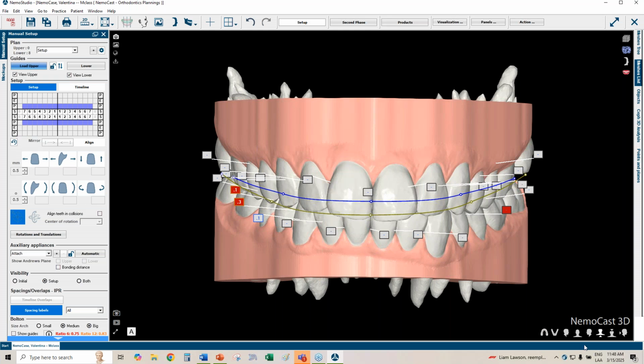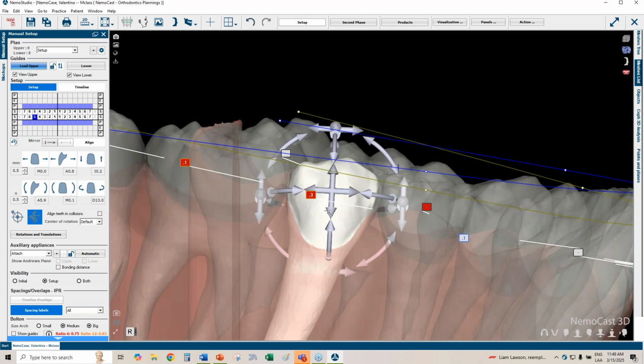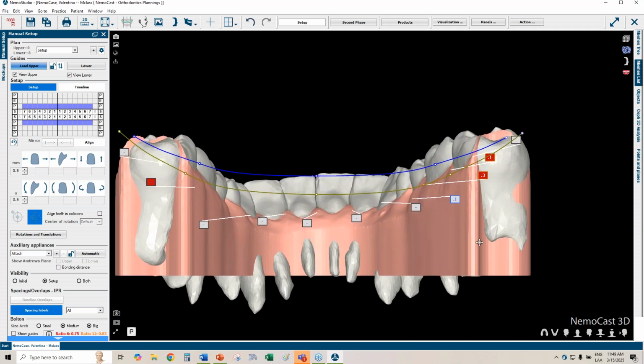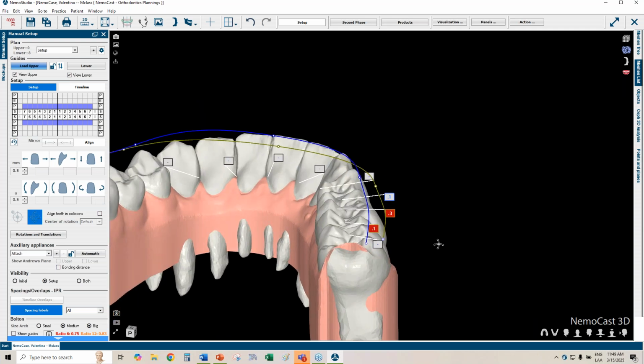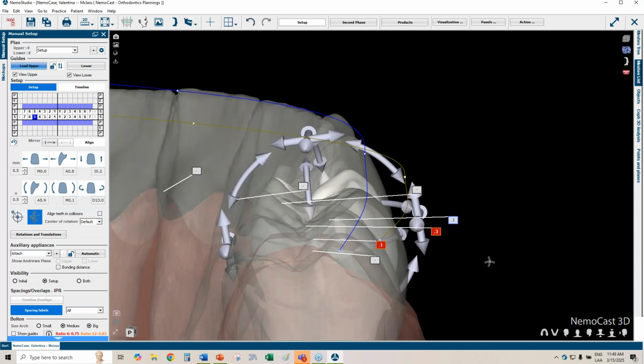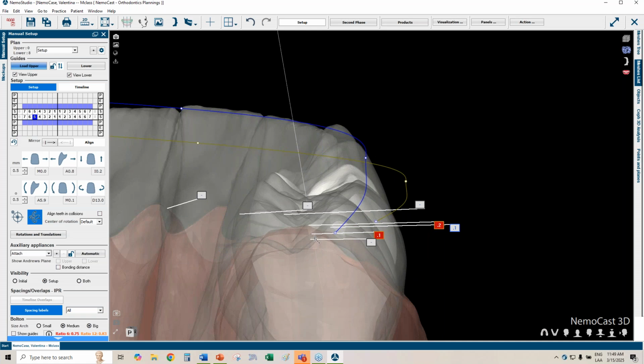Next up, we just have to take care of our needs for space. So I know that as long as I maintain myself within the parameters, nothing is going to go wrong right here. So I can now start visualizing the oblique ridges of the teeth to fit correctly.